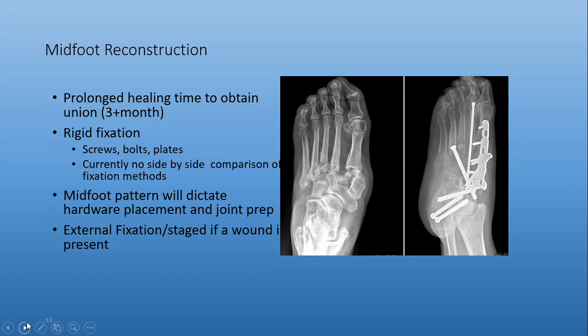So if you said dissolving, what's a better term for that radiographically? It starts with an R. Resorption. Yeah, exactly. So there's resorption of bone and then building back up of bone. You can kind of see here that there are some pseudo fusions occurring, right? Can you see my mouse move? Yes. All right, so see right here, you have some callus formation and some bony product being laid down to try to stabilize that unstable joint.